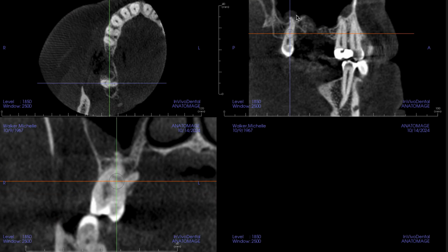So my thought is that this tooth should probably be seen by endo. Oral surgery, I don't think is going to look at this with the magnifying glass that we're looking at it. Perio might, but I think endo would be the most likely specialty to dissect this and give the tooth the best chance for survival. The problem is this strikes me as an infection of periodontal origin.